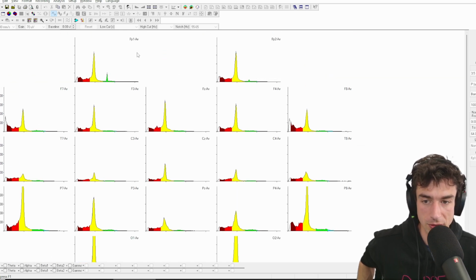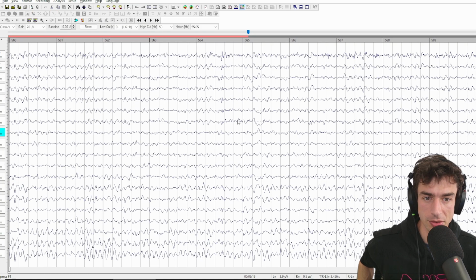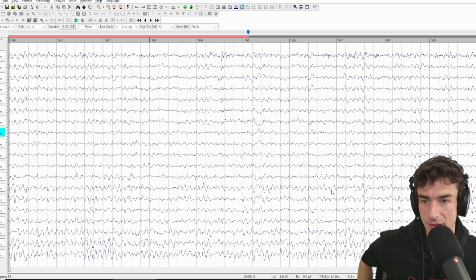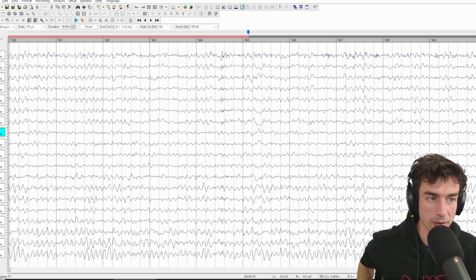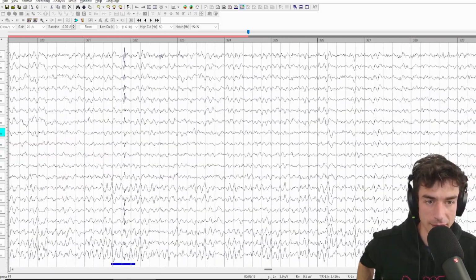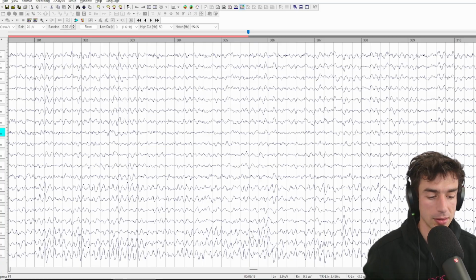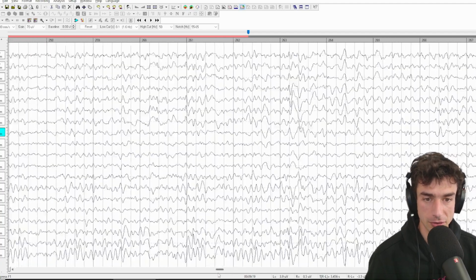I'm curious what this 16 hertz feature is and a little bit skeptical. We can map it, but I will return to the raw to try to get a little bit of insight into what's happening over there at FP1. Typically, muscle activity would not have that kurtotic or narrow of a peak in the spectra.